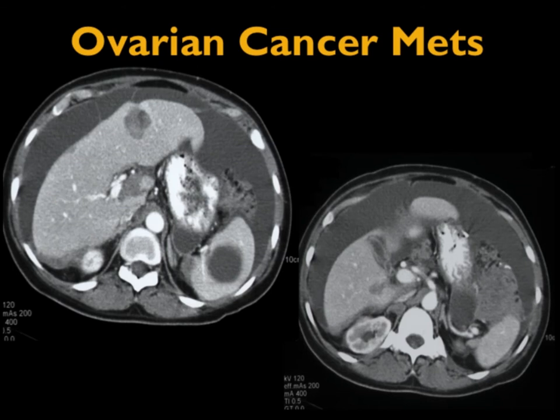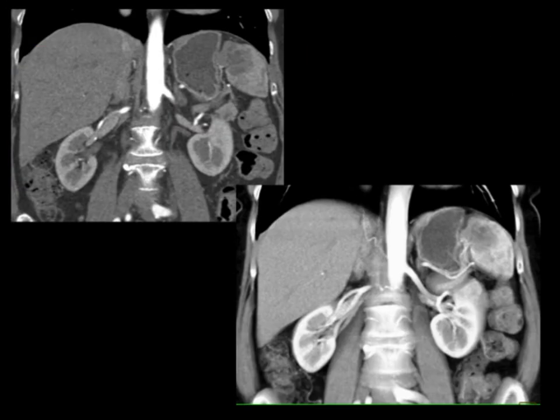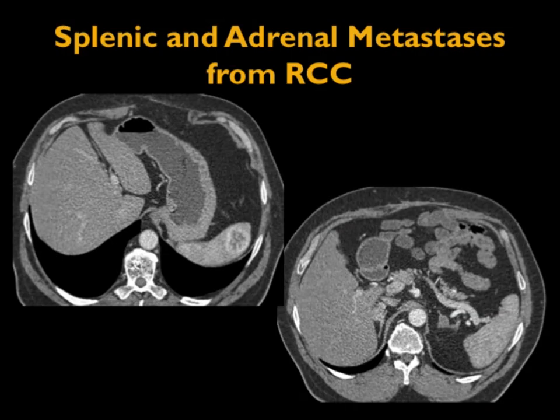So for example, ovarian: there's a lesion in the spleen, it's on the surface. Splenic lesions, hepatic lesions, ovarian cancer, often are on the surface, no problem. Another example, implants on the surface pushing into the spleen, nicely shown in coronal view, metastatic ovarian cancer to the spleen. Splenic and adrenal metastases, both are vascular in this case. You could think, could this be a funny hemangioma or something? You may think about it.